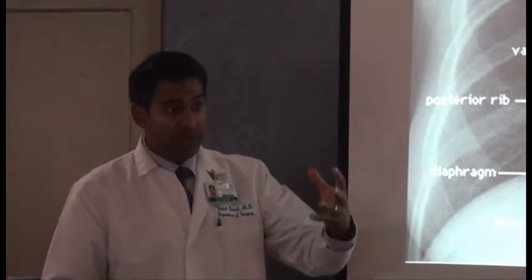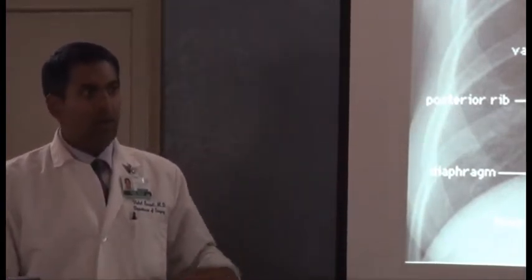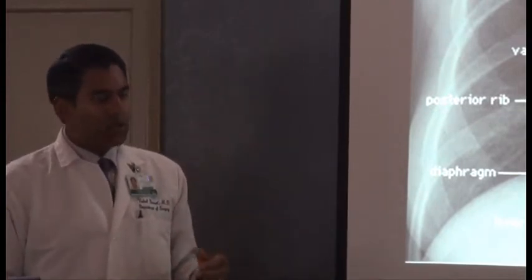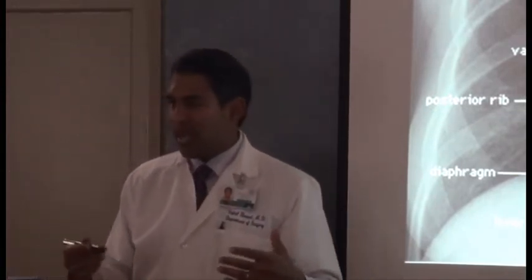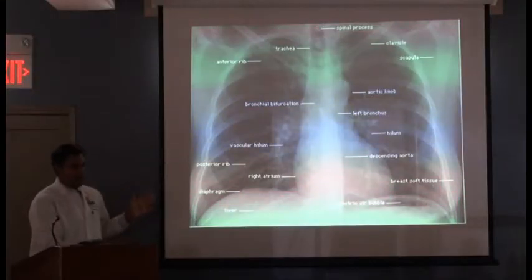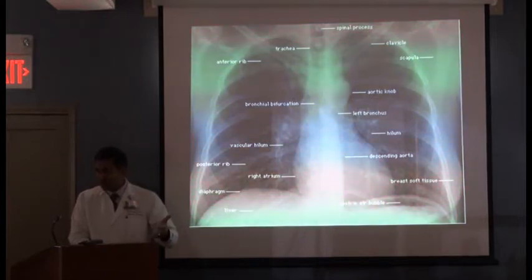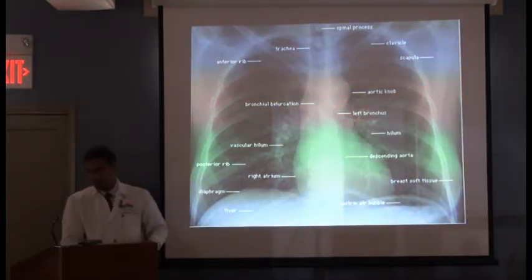What else could it be, Lisa? The heart's just huge. It's just filled with something around the heart. Precisely, it could be a tamponade. So let's say we get a gunshot wound or a stab wound to the pericardial area and we see the heart's just massive. God, you gotta think to yourself, maybe this patient actually has a tamponade, especially if they're hypotensive, right? So that's where a chest x-ray can be very valuable sometimes.